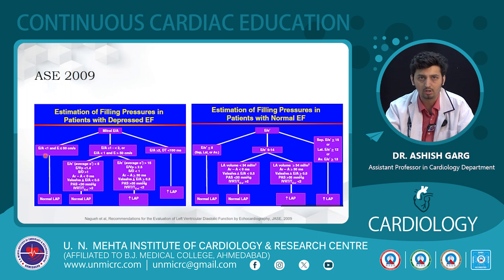If the E by A velocity is less than 1, it may be normal LA pressure, and the E by E prime more than 15 is also suggestive of an increased LA pressure. The left atrial volume index more than 34 ml per meter square, the E by E prime more than 15, all these are suggestive of diastolic dysfunction and increased left atrial pressure.